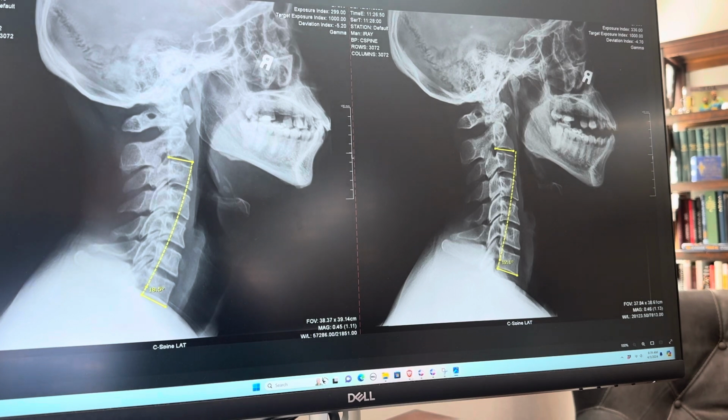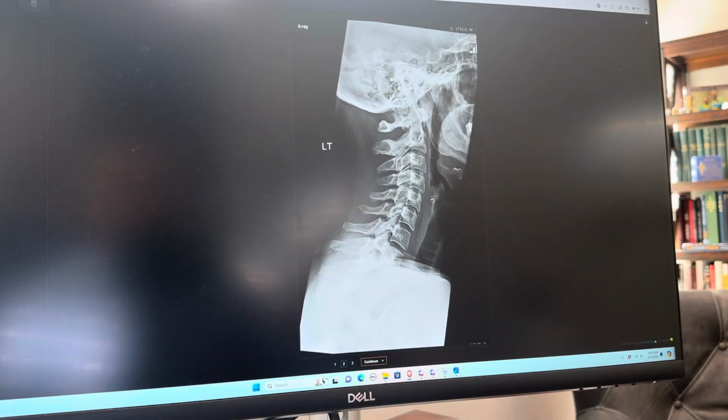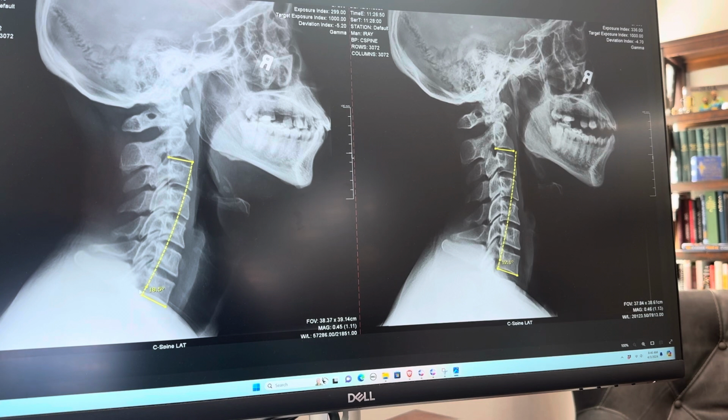And if we come back over to the film that we have, we can see that there's still much more room for progress to be desired, right? The ideal that we're looking at over on that other film is probably around 25 to 27 for this individual. And so what we're seeing here is that the right type of care, or the right presentation of delivering care, should require a doctor to progressively take photos or x-rays of your case to show you that they are reconstituting and delivering that which you asked for.